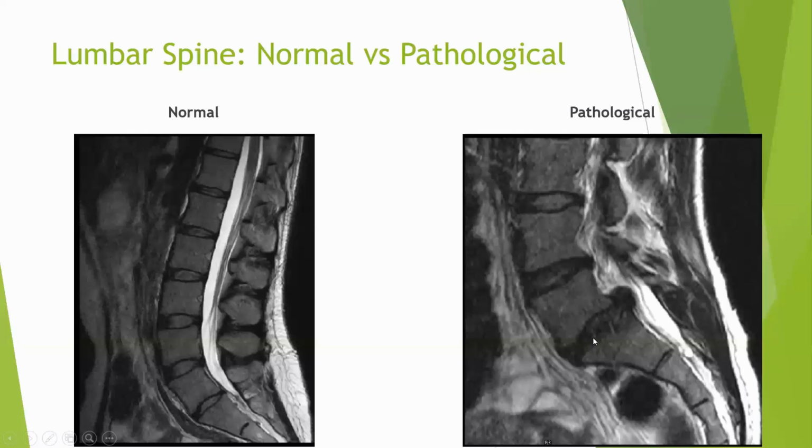And then I can talk about many things, because if you see the lumbar vertebral body height, the disc height, they are again getting reduced. So you have to mention that. If you check the foraminal opening right over here and here, it's getting obliterated, or essentially the foraminal cavity diameter is also reducing. So those are the other things that you can also come across and visualize or analyze.